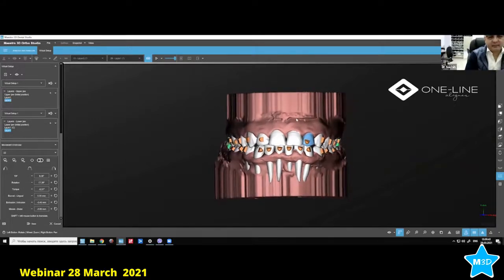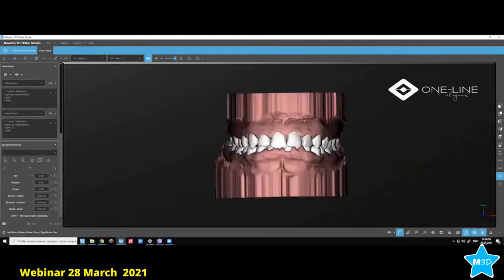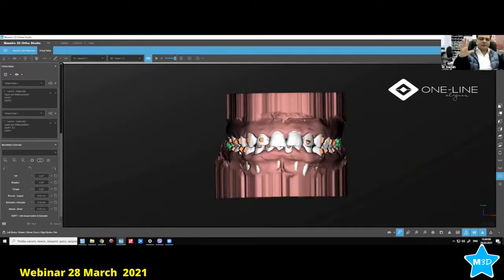So I'll just play it again, and I believe it will be clear for everybody. So we're doing expansion, we're doing alignment, and we're doing intrusion.